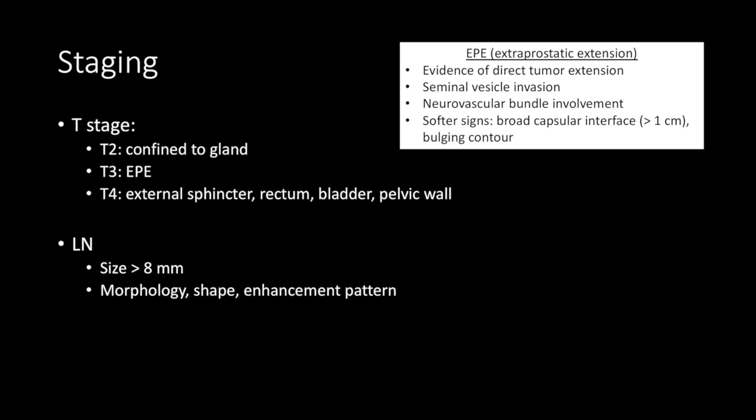And then for lymph nodes, we're generally looking for enlarged or morphologically abnormal nodes, so round, heterogeneous nodes, etc. And if they're obviously involved, we're going to see that. But unfortunately, even some smaller nodes that look morphologically normal on MRI may be involved. So our job as radiologists is to point out the nodes that are obviously involved, aka enlarged or morphologically abnormal.